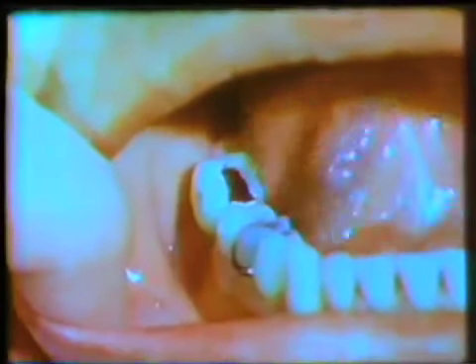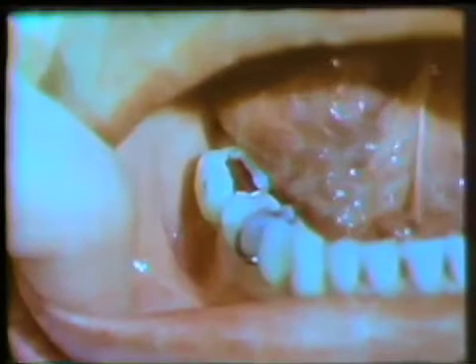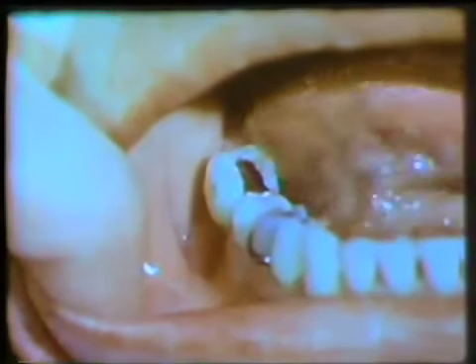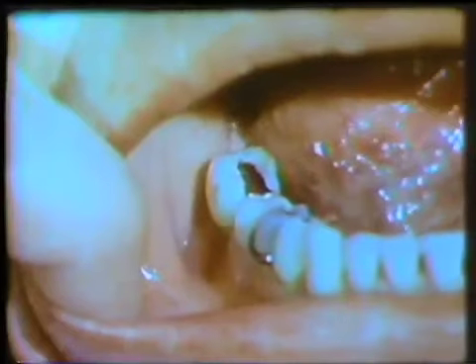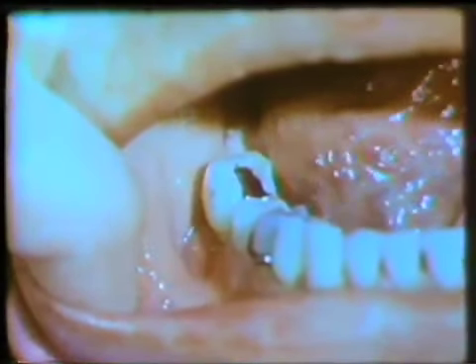However, there are certain disadvantages. These include no adjustability of the rigid retentive component, little tolerance for error in the casting, well-prepared occlusal and cingulum rests are essential, and the potential that some patients may object to a removable appliance.